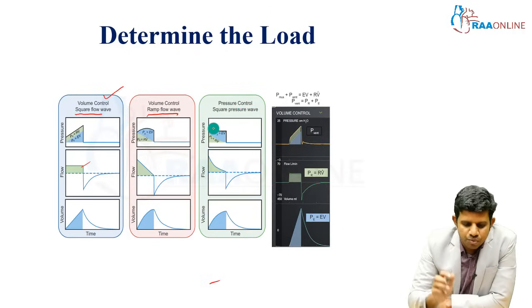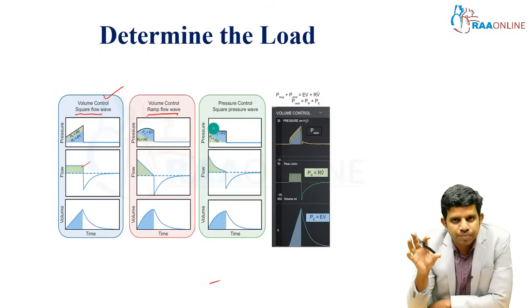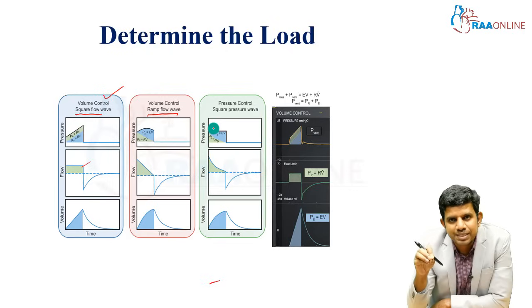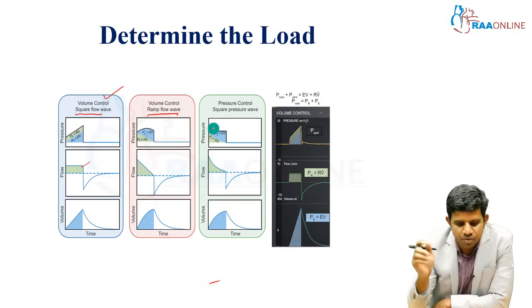In the volume control mode, volume is the independent variable. Irrespective of my resistance and compliance, the flow and volume will be constant.